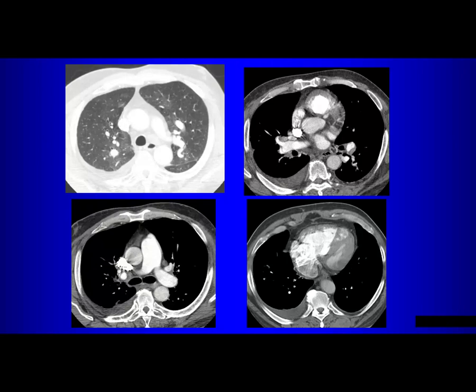They calculate the velocity across the tricuspid valve. The velocity of what? Speak up. They calculate the velocity of the tricuspid regurgitation.